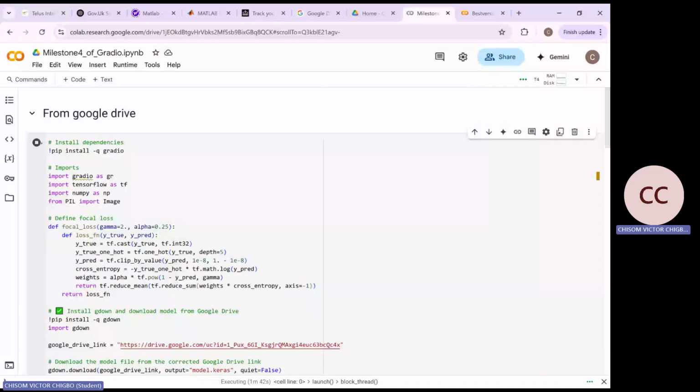So I have been successful in building a model. What this model does is make predictions based on the severity levels of osteoarthritis off of the pictures it's been trained on, and what it has come to learn and observe and take away from the differences in the pictures. So the whole project uses a deep learning model to predict the severity of knee osteoarthritis from X-ray images using a simple web interface built with Gradio.